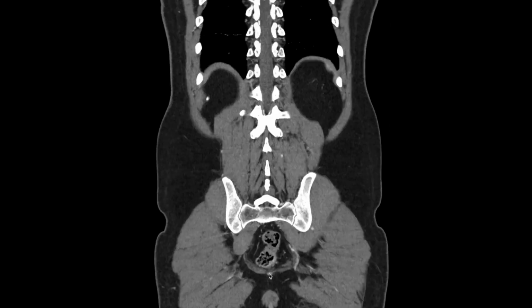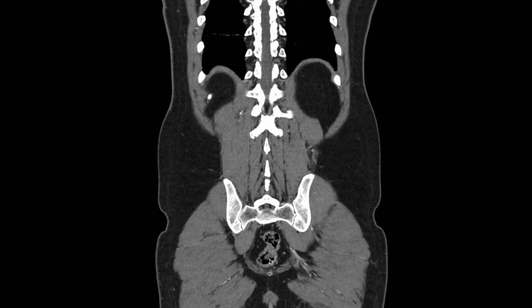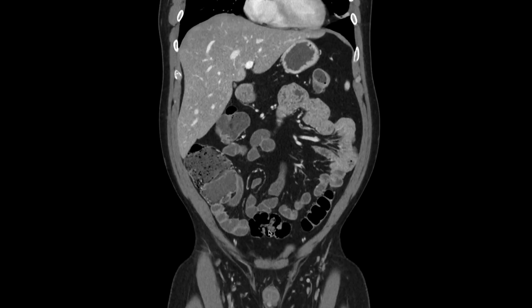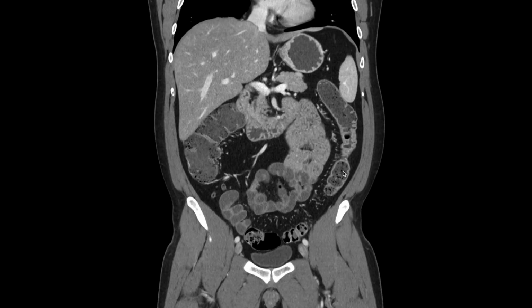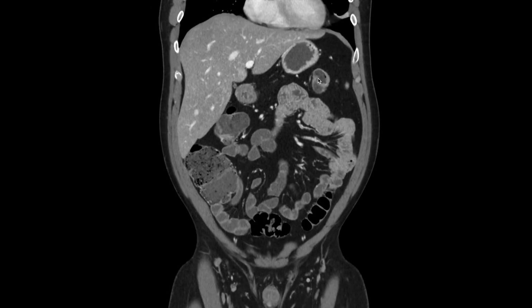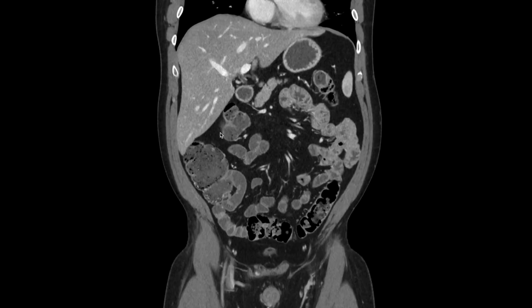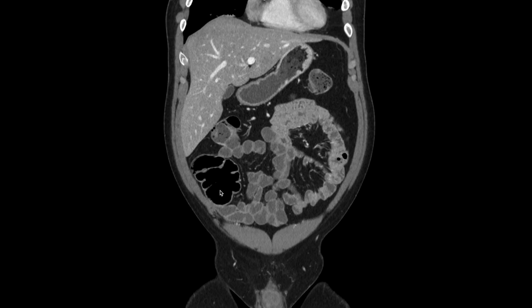And we can run the gastrointestinal tract now. So here's the anal canal, anorectum. Here's the rectum. Sigmoid colon, and we're going up here to the descending colon, splenic flexure, transverse colon, hepatic flexure, ascending colon, and cecum is here.